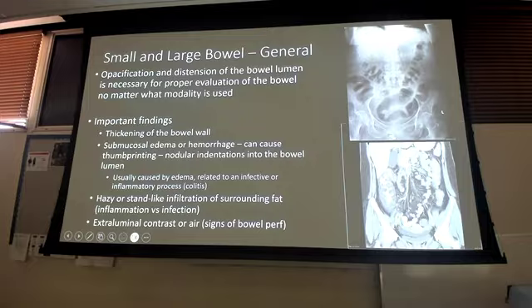Right? So that should stand out when you start looking at more of these normals, the thickening of the bowel wall. If you get into the CT, look at my ascending colon. Look at the dark gray. That's my bowel wall. The white is the contrast that they drink. Okay? Look at the contrast. Look at how thick the bowel wall is. You're going to see something that's called thumbprint sign. We're going to take a look at that here in a minute. Right? So that's going to be like your inflammation of the bowel wall. So your colitis, you can see it's all inflamed. I've got infection or inflammation of the colon. That's going to be your colitis.